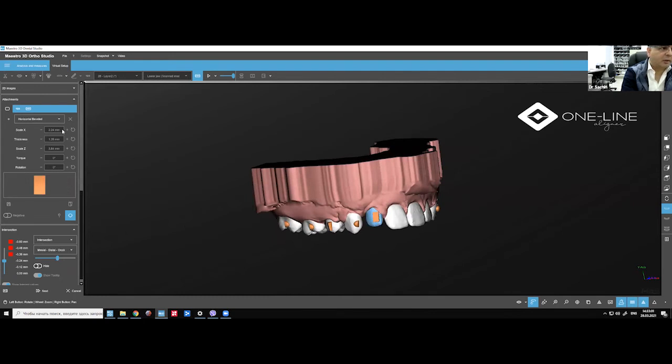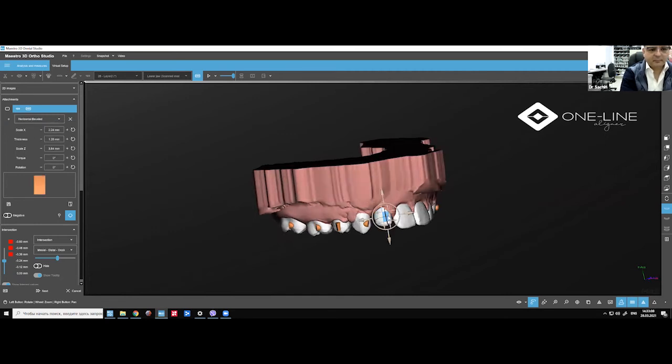Or you go to a rectangular beveled one. I like these a lot. You are doing rotation, so your attachment has to be as much as possible on the corner.